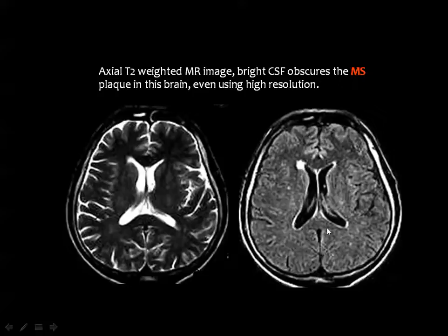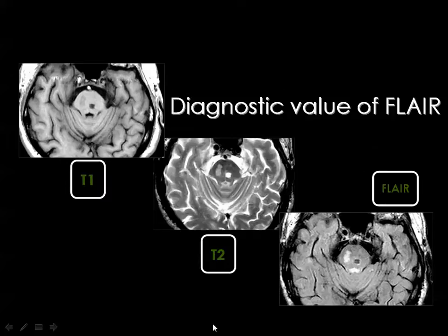But in the FLAIR images, FLAIR means that there is attenuation of the fluid signal, and it is a T2 weighted image where the CSF is black. Then the lesion is bright and the CSF is black. Then you have the chance for adequate visualization of this lesion compared to this T2 weighted image.